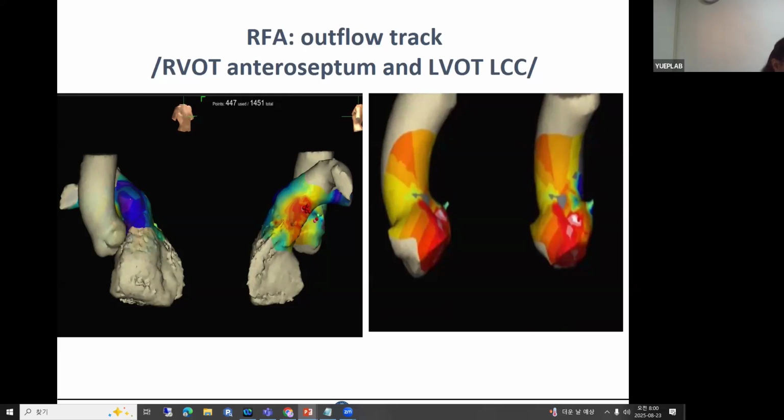And then also raise a question about other possibilities of interpreting this better. If you had the third point even earlier below here, how to explain that? So it's a keen observation and then careful evaluation that is important. Third thing, I think your answer is going to lie in mapping the EGM from here and here. You click at the point and take a look at the EGM.